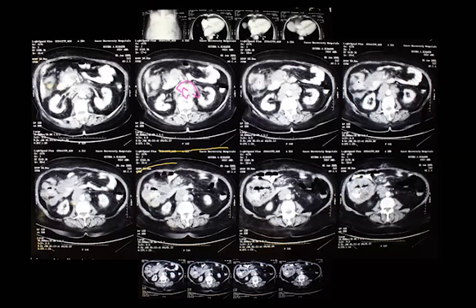Yalla, what is happening? What is the density? What is the hyperdense lesion surrounding the aorta? Hyperdense? Are they really hyperdense? At least compared to the aorta, what are they? At least compared to the aorta, they're hypodense. They're hypodense, okay. Are they homogeneous or heterogeneous? Heterogeneous, maybe. Okay, and where are they? Are they in front of the aorta, behind the aorta, beside the aorta? In some cuts beside the aorta, and in some cuts surrounding the aorta.